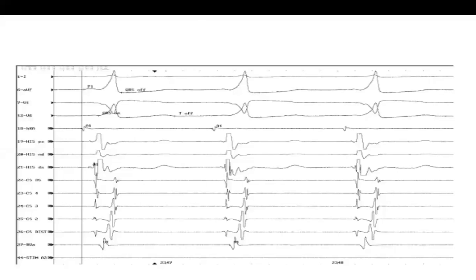Okay, can we know this from the ECG to start with? No. And the ECG here is going with left bundle branch block. I would think it is a right accessory pathway. The ECG looks like a right accessory pathway. And you have AVF, inferior, anterior, because of a positive delta, and V1 is negative. So this is very deceiving.